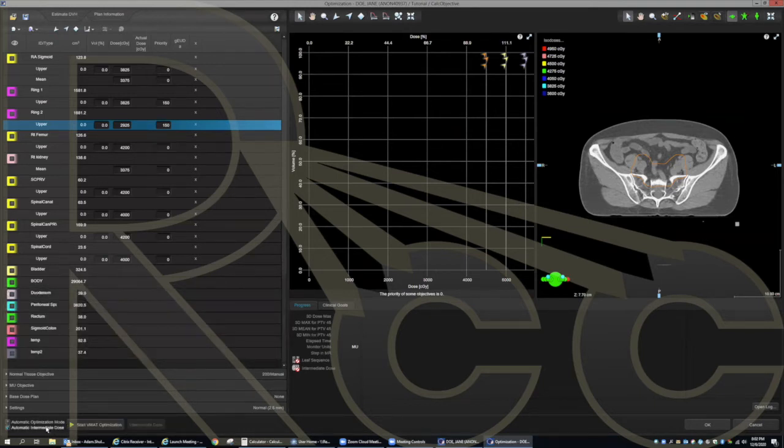I'll have this intermediate dose. This will calculate in step 4. It's a different dose calculation in your optimizer than it is actually in Eclipse, which could give slightly different doses. So I'll do an intermediate dose, which will be my actual Eclipse Acuros calculation, and then fine tune it later. So I'll keep that, and I'll go ahead and start the optimization.